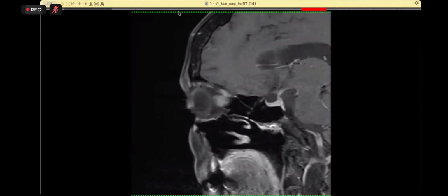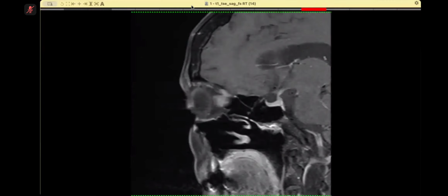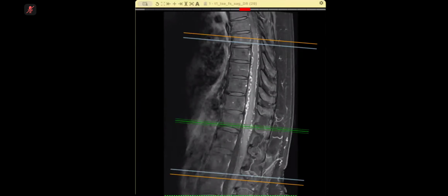Okay. So your first case, I will slightly modify my technique because this is a very, very challenging potpourri. And because of the teaching factor, I think I will not take a classical Viva, but I will show you according to what is possible considering the time factor.